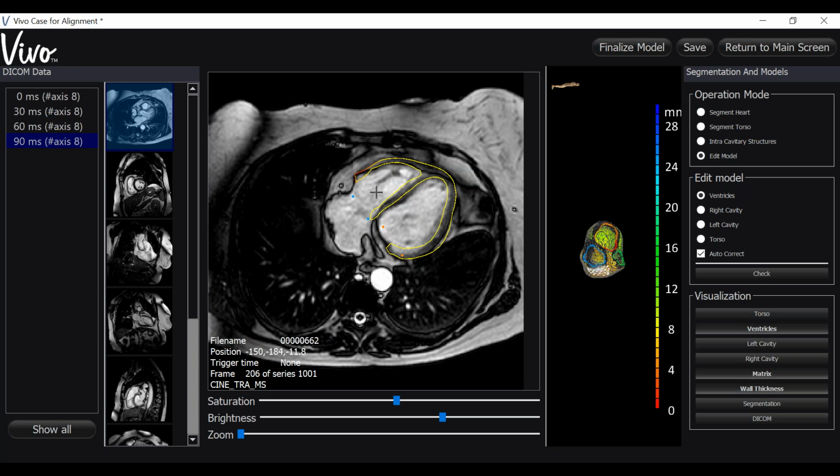You want your outline to have nice rounded areas, no pointy sections. It should be nice and round, because if not, it'll make little jagged sections on your model.